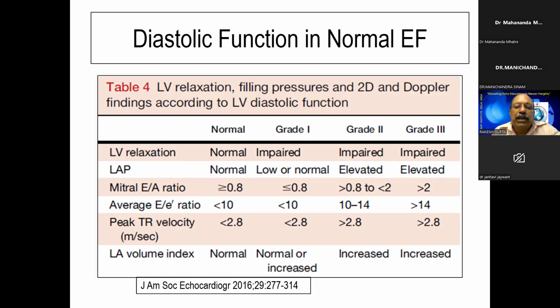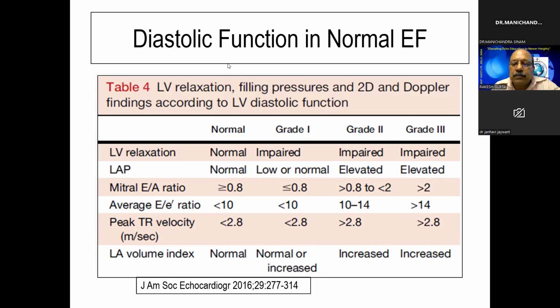All right. So let's move on. One more doubt, sir. While measuring TDI and E prime, they mentioned to reduce the gain and reduce the filter. There is a gain knob. How do we reduce the filter to get better images? Okay, so let me just close down this image.